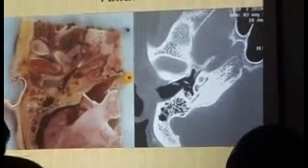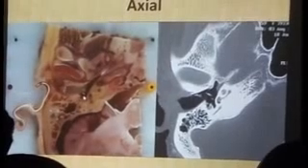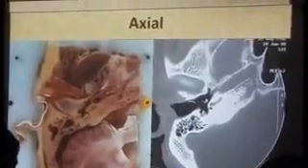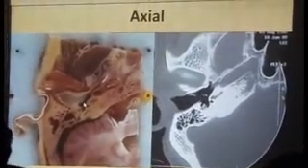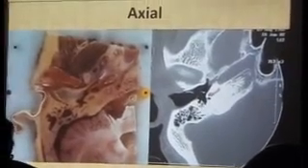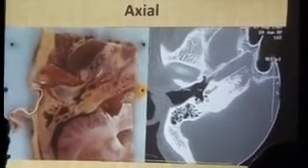That is the area of the facial nerve, the facial recess, and the sinus tympani, again correlated on the gross segment. Finally, lower down, just a little part of the tympanic membrane is faintly visible here, correlated here, and the lower part of the malleus handle, the facial nerve, recess, sinus tympani, the promontory with a basal turn, and that is your round window niche.